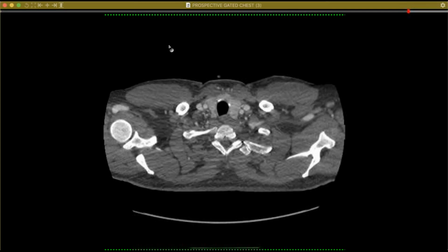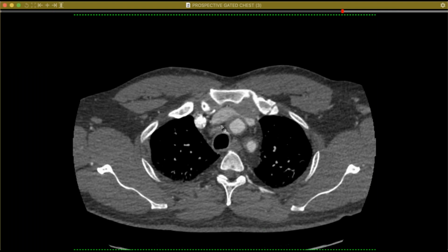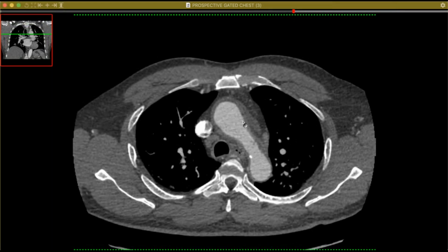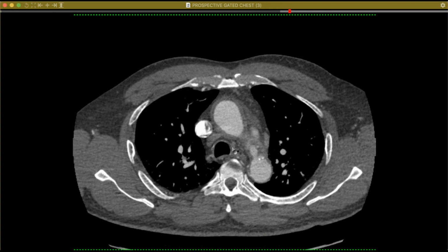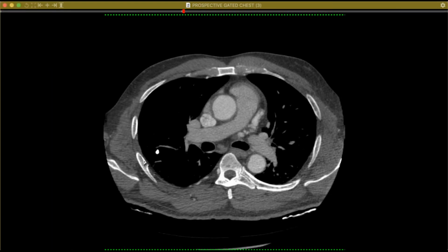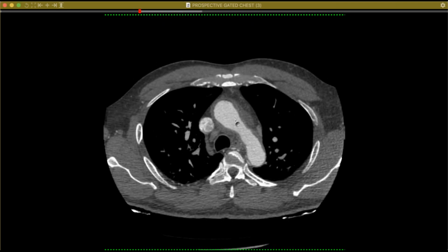So David showed us some paleoradiology. I'm going to show you some neoradiology. So this is another case of syphilis, but you can see a modern CT scan here, contrast enhanced, and this patient has striking wall thickening of the ascending aorta. You can see some atherosclerosis and a little bit of descending aorta involvement, but this is primarily in the ascending aorta. I have a couple of studies, and I can't remember the time frame of these. This was a little bit earlier on, but I think it just shows a gated study here. Quite a bit of thickening here.